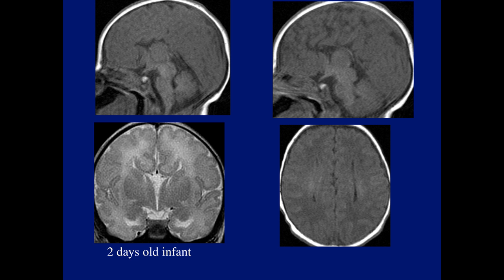Okay, this is a 2-day-old infant. What is the problem? Correct. As everybody says, Dan, the resident Cecilia, the reading room down in Fitkin: agenesis of the corpus callosum.